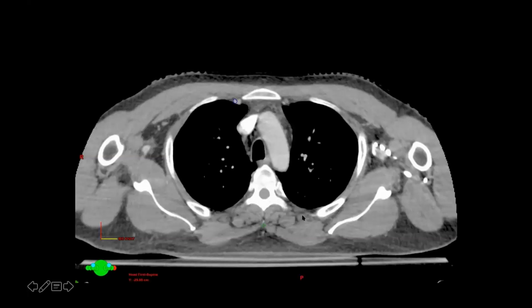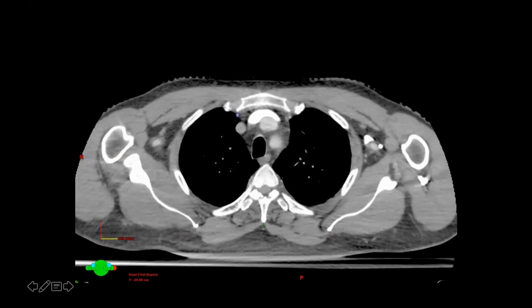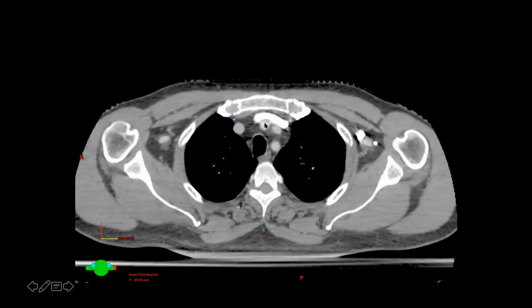Okay, so one important thing is it's always a controversy to identify the transverse cervical vessel and to what level to include the transverse cervical vessels, since it moves across the neck. So I'll just try to demonstrate that. So again, this you've already seen from the arch of the aorta.